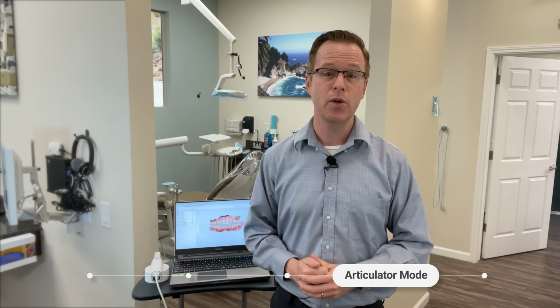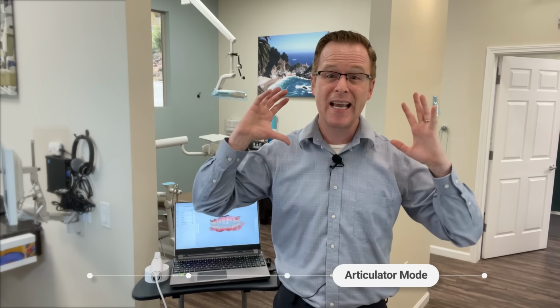Once we're satisfied with how the model base and appearance look, we can then create the articulator functions built into the model. The articulator pins allow us to create pins so that if we want digitally articulated models, it makes for a very simple operation. Instead of having to export these files into a dental-specific software that may cost thousands of dollars, the model builder function within the MeditLink software has automatic articulator functions as well as a text function that we can emboss or engrave on the side of our models.